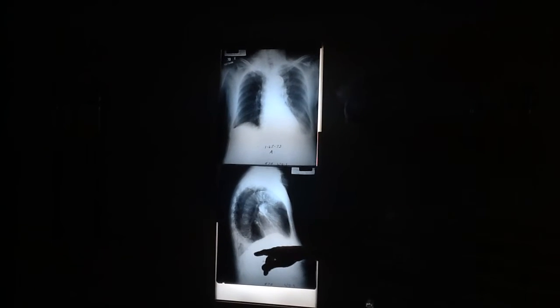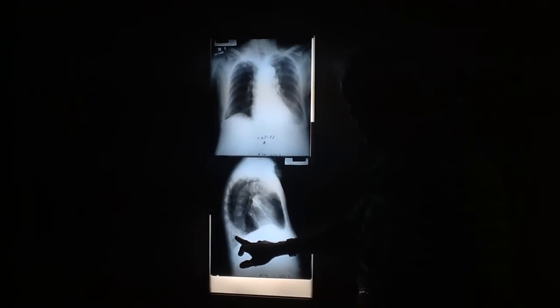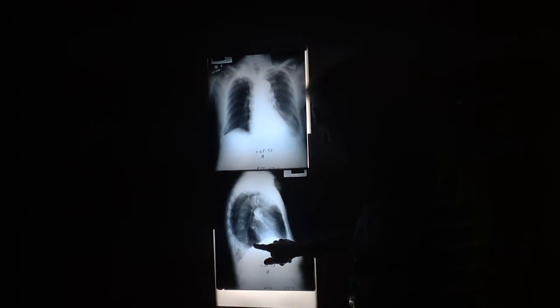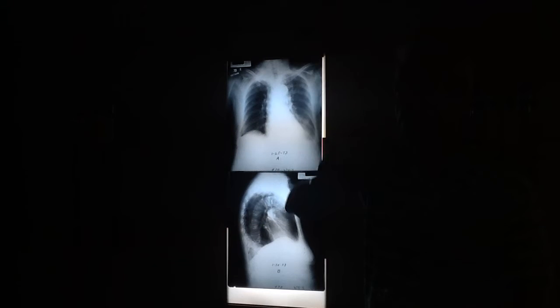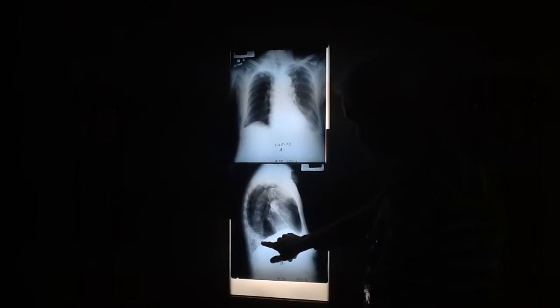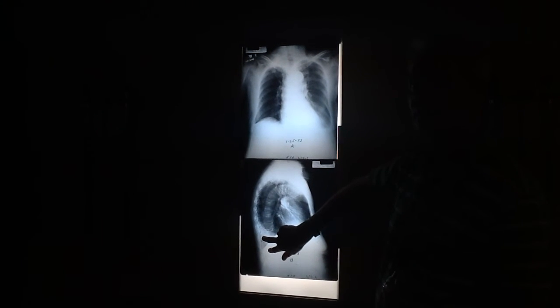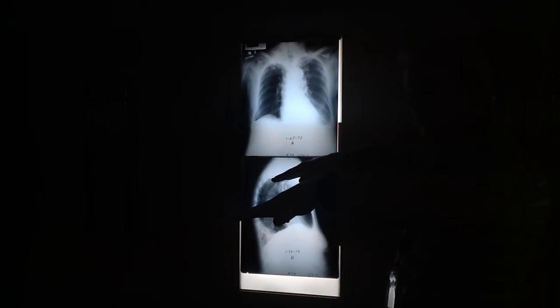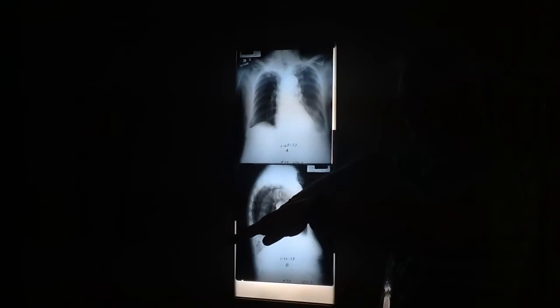So we can actually look at that and say, well, if this was on the right side, this would do this. And it would all bleed and just blend right in, exactly. But since this goes over the top of it continuously, these are not touching each other. They have to be like this. Not like this, they'd silhouette if they were like this. They have to be like this.